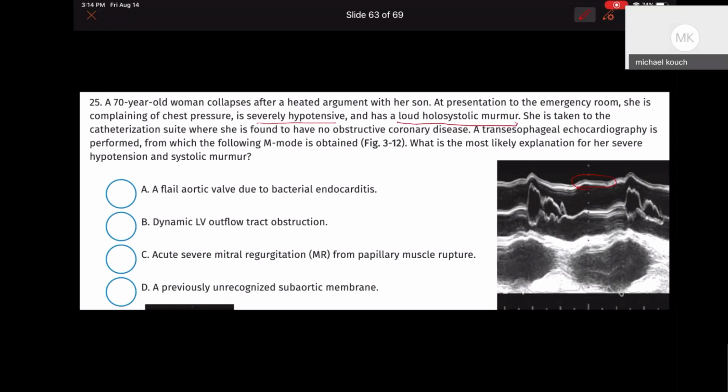Mitral regurgitation. Or aortic. Well, it won't be holosystolic if it was aortic stenosis. Right. It's really crescendo. But you're saying a systolic outflow obstruction, right? Something blocking the flow going through the aortic valve, right? So what are we seeing here? We see our valve opens, right? And then midway through, what's happening? It's starting to shut down, right? So something is causing this to shut, right?